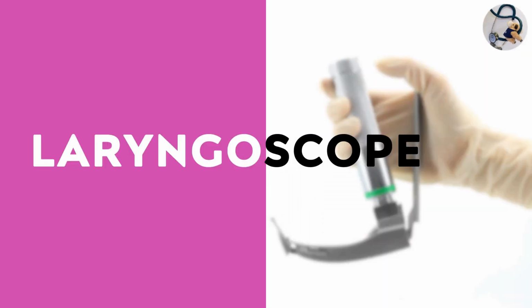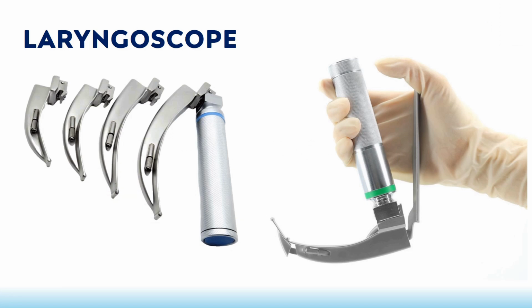Starting with laryngoscope, this instrument is laryngoscope. So laryngoscope is an instrument which is used to examine larynx, that is the voice box, vocal cords and the surrounding structures. It is also used to help insert ET tube during intubation. So these are the different sizes of the laryngoscope blade.